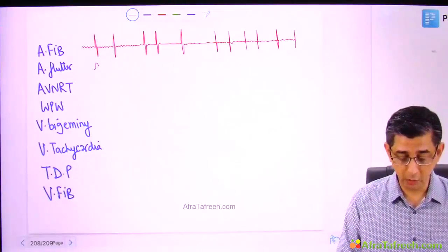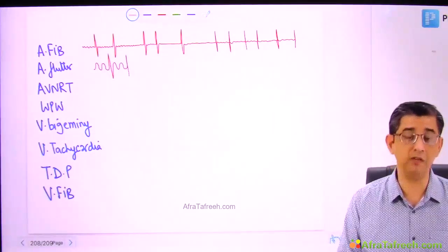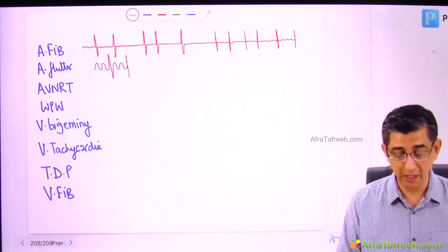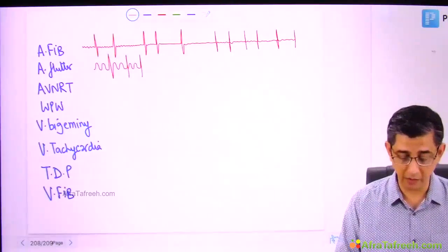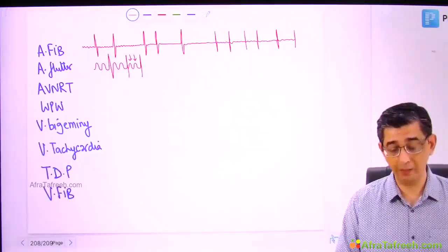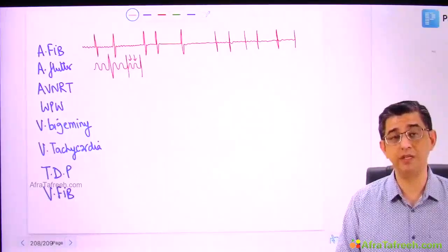In atrial flutter, you will always notice at least two abnormal waves before every narrow QRS complex, and these waves will neither be having characteristics of a P or a T, both height wise as well as duration wise. And apart from this, I also want to say that suppose you see two sawtooth waves, like at the moment I have hand drawn two sawtooth waves before every QRS complex. So that means that this is a 3:1 conduction. Don't answer it as 2:1, answer that as 3:1 conduction.